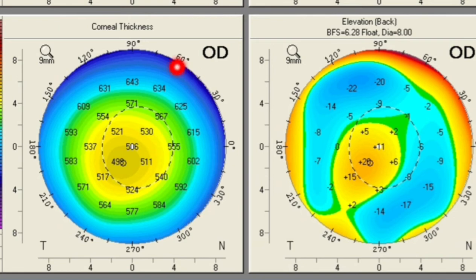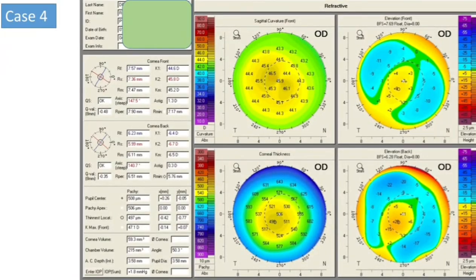And after that, if we see the corneal thickness also, if you calculate the difference between this 554 and 540, or 571 and 524. So, here a little more steepening is there, like 567 and 517. So, it is more than 30. But even after that, we need to look at the red curve whether it is deviating before 6 or not, then only we can come to a decision to diagnose an ectatic condition or not. Okay. So, let us move to the Belin-Ambrosio enhanced ectasia map.